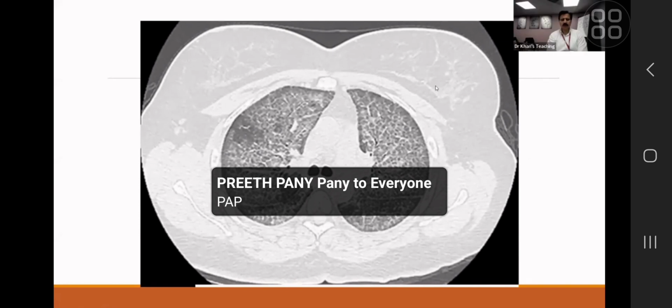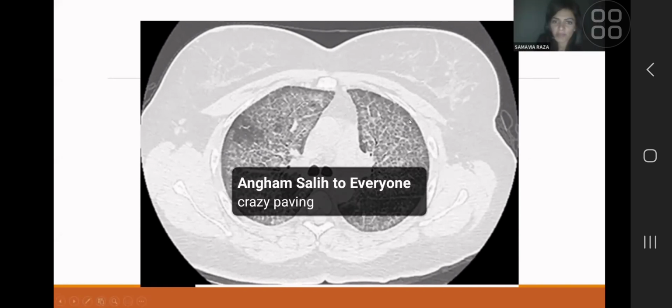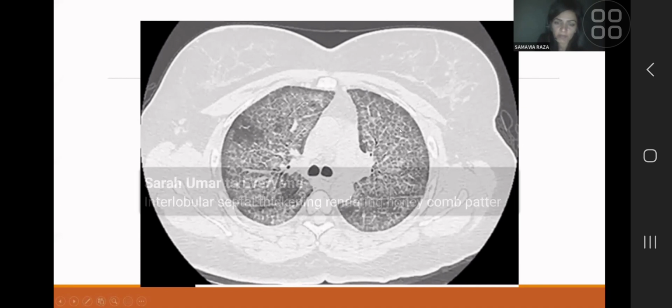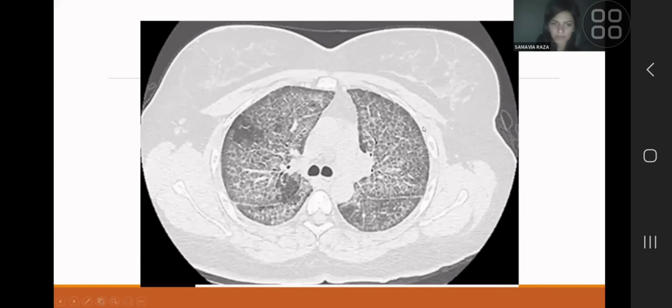Over to you, please. Okay, very good. Almost none of you got confused. This is indeed all diffuse ground glass with a few lines in it that you can't explain away as vessels. So this is superimposed septal thickening onto a ground glass. And yes, it could be pulmonary edema, but this specifically histologically is alveolar proteinosis.